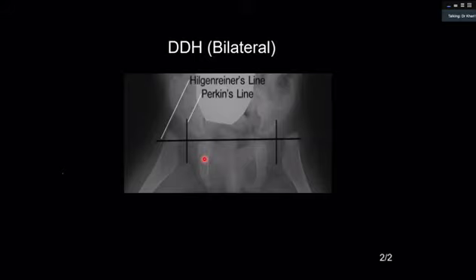And it appears there is a range between about 4 months till about 7 months, somewhere in that category. So here you can see this one, but barely, you can have a debate if this is visible or not. But actually, you can infer where it will be, because this is the neck. So you can infer that it is sitting there.